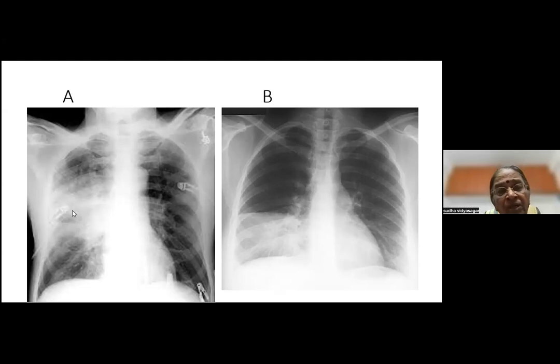So if at all, this is where you will get into trouble, because all three lobes can come here. The upper lobe can come, this rib can come here. So it can be an upper lobe segment except the apical, or the apical segment of the lower lobe, and to some extent the middle lobe.